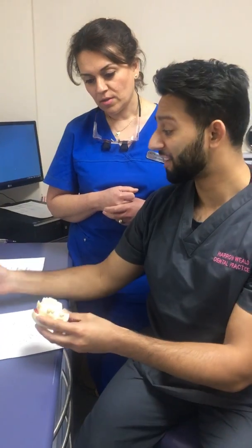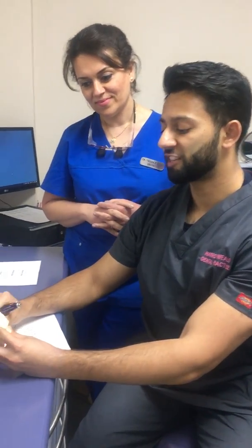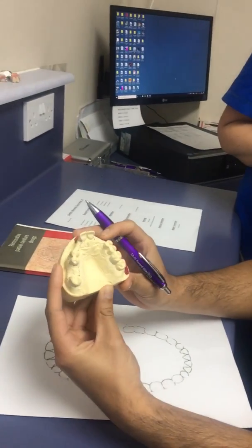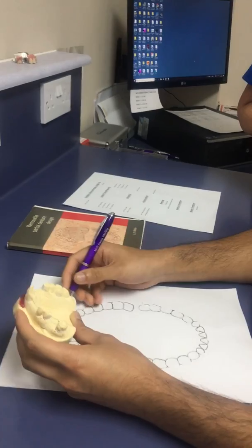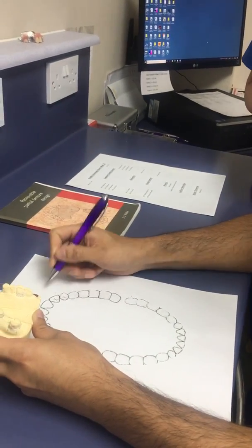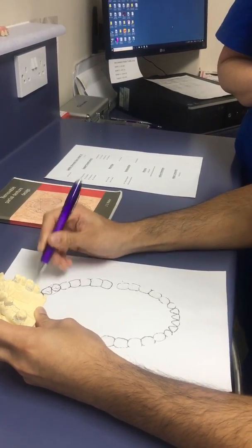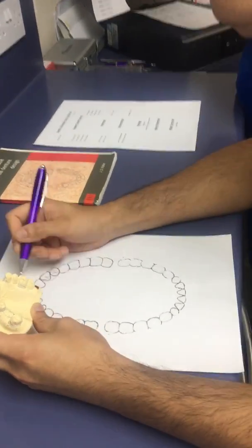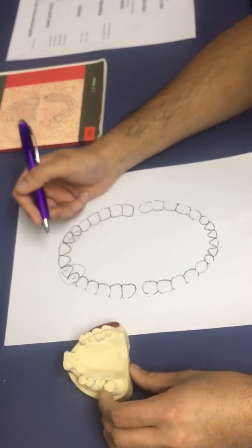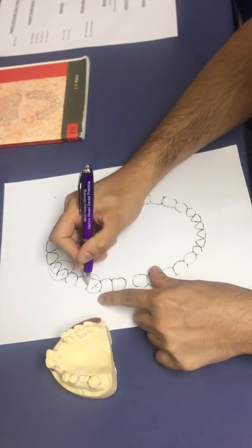Firstly, thank you for letting me borrow the book. The book is really good and insightful. So the first thing that you do is you identify the Kennedy classification. This model is a Kennedy class 3 mod 2, and then you identify the saddle areas on your denture design sheet of paper. So you know the teeth that you're going to replace here on the upper right 2 and 3, so you circle them, and that's similar on the other side. And then the last tooth on the upper right 6. So you've got your saddle areas.